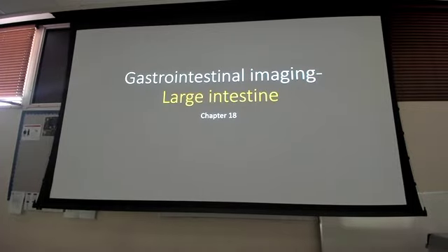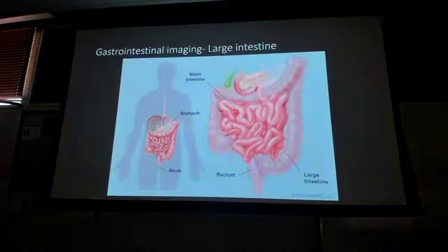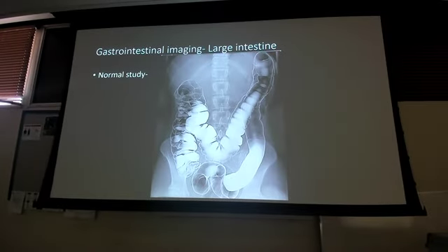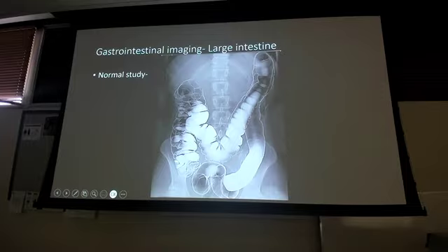That's it. Besides obstruction and ileus, Crohn's disease for the small bowel. Okay. Large bowel. A couple of different things. So, this is a double contrasted study. This is barium and air. So what happens is they put it up here into the rectum, they blow the balloon up, and then they pour the contrast in, and then afterwards they pump air up to kind of give two contrasts. They call it double contrast to help really see the large intestine well.